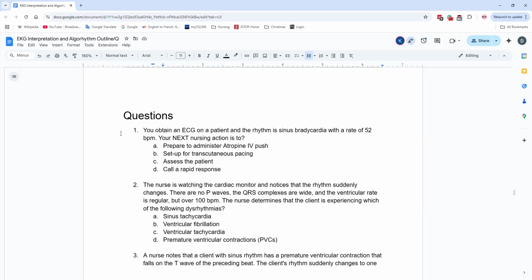Definitely so, always check your patient first. Do I have enough information? I know they're sinus brady. I know their heart rate. My kind of luck, this would be a PEA, but yeah. Are they symptomatic? Is this normal for them? Is their heart rate so low that they're now becoming hemodynamically unstable because their cardiac output, which is our stroke volume times our heart rate, is too low, so our cardiac output goes down the drain.